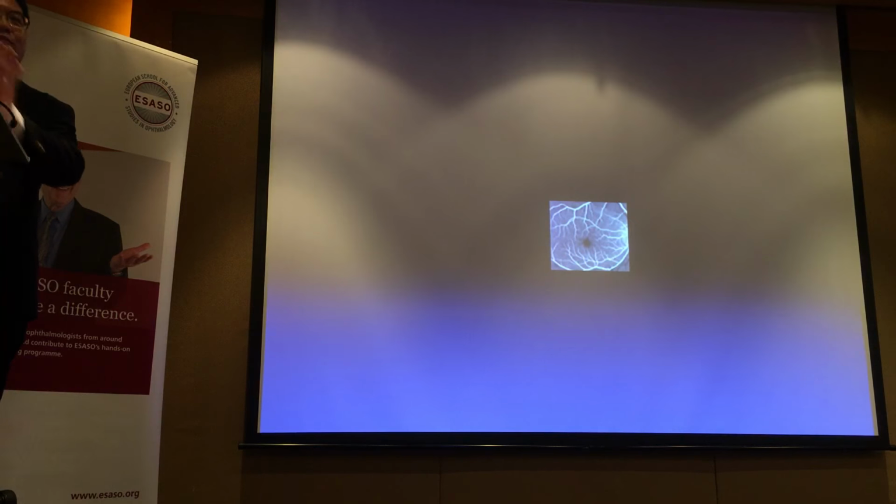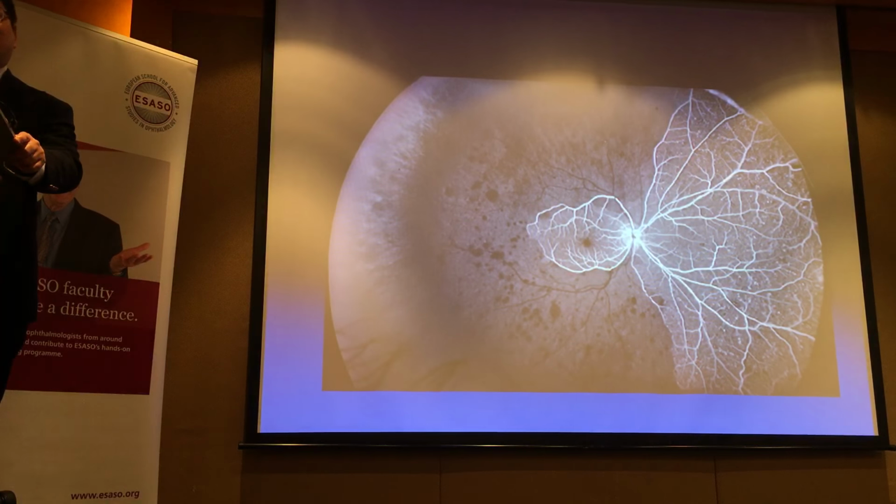I know we're talking OCTs, but how does this angiogram look to you? Small. I was too lazy to expand it. You probably know there's some trick involved, right? I'm not that sloppy with my slides. No financial interest with doctors.